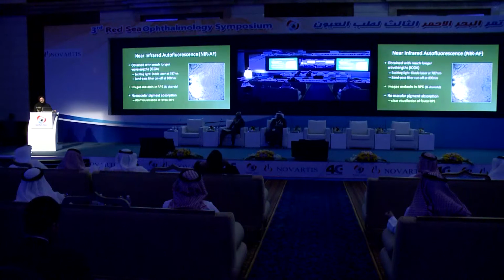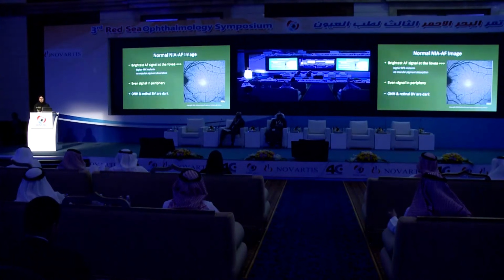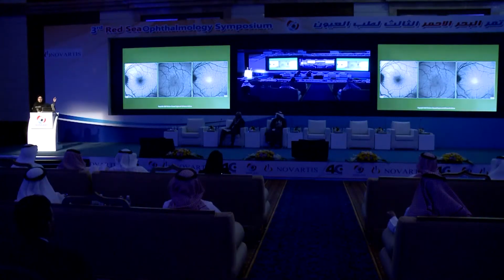We can also do fundus autofluorescence with a light that is near the infrared range, and in this case we're no longer exciting the lipofuscin, but we're exciting the melanin inside the retinal pigment epithelium. So in this case, what we'll have is completely the opposite. We'll have a very bright fovea because the RPE under the fovea is highly packed with melanin. And so here are the three images that you can recognize now. The one on the left here is done with a blue light, very high contrast and dark center.